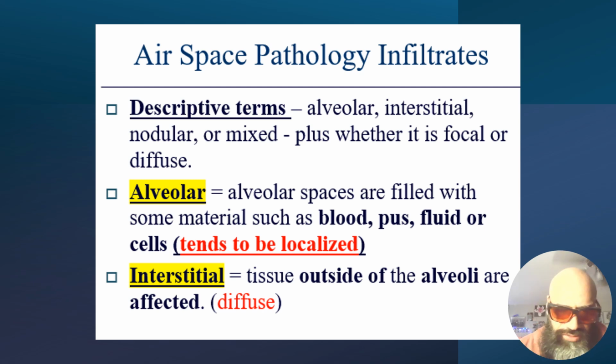These tend to be localized within the region and the area of where the alveoli are located. So you'll start to see fluffy patterns that are shaped round like the alveoli. They may have a dark center that represents a little bit of air that's left in the alveoli, but the majority of these are going to be white, corresponding with a liquid density, and they're localized much more towards the mediastinal region or within the entire lungs.